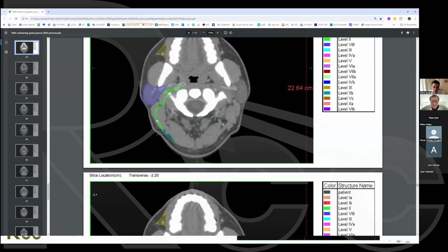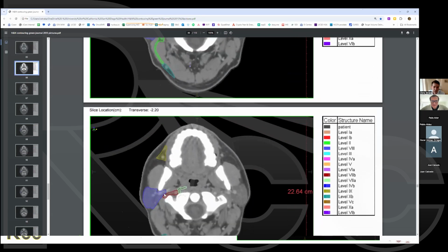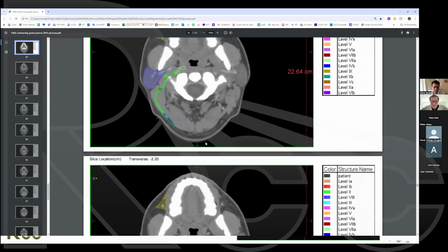We're usually just being a bit more generous and with at least sort of a 5 to 7 millimeter brush, which I think is appropriate. And so similarly, I don't tend to draw these as assiduously or precisely as they do here. It's something a little bit more looped, and we'll see that in a couple of example cases.